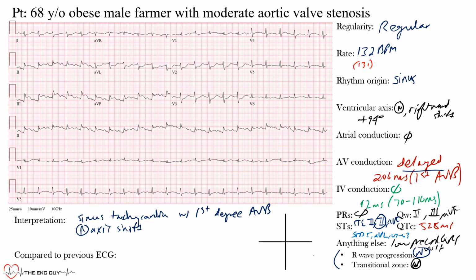And then we did mention some Q waves that were developing there in those inferior leads, these ones here. Okay, as well as ST elevation, and we see reciprocal changes in leads 1 and aVL. Okay, that's going on there. You also see some depression, maybe in V1, but mostly in V2 and V3.